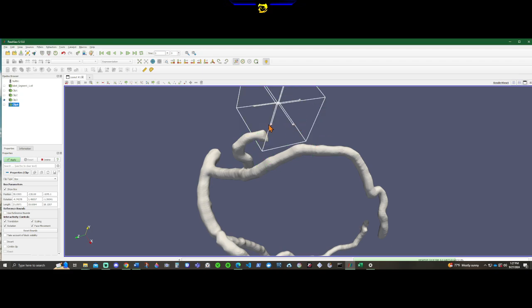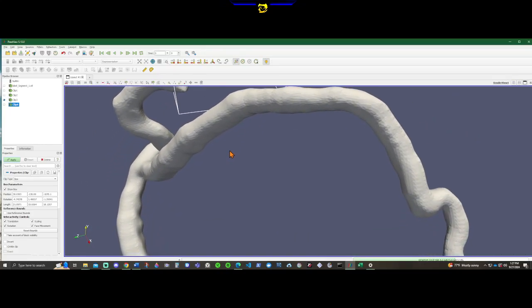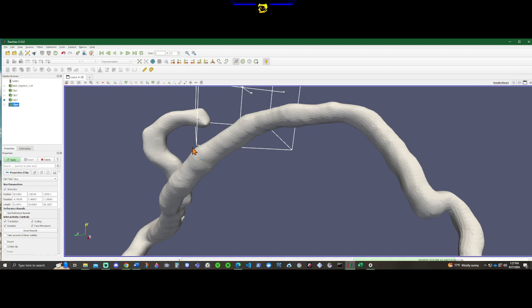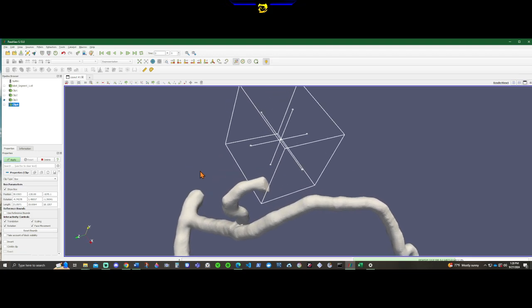This one's a bit tricky because of how it ends, but if you just only pay attention to before any irregularities, so if you focus your attention on here and here, because if you were to move the box a little bit further out and trying to get like the corners, it would make your life a little bit more difficult. So I think this looks good.